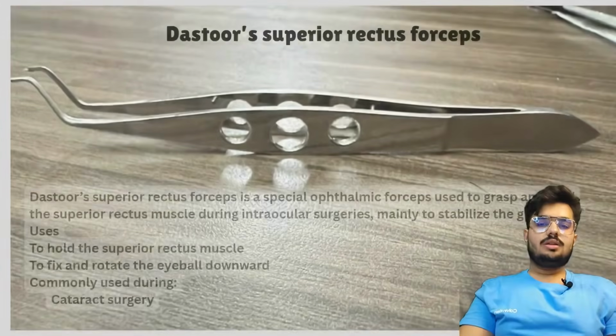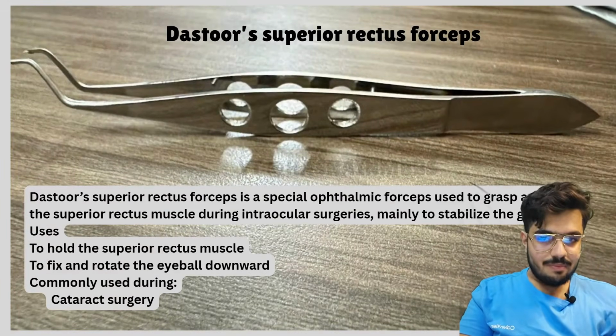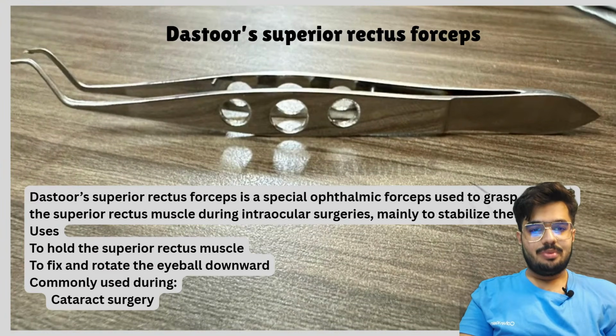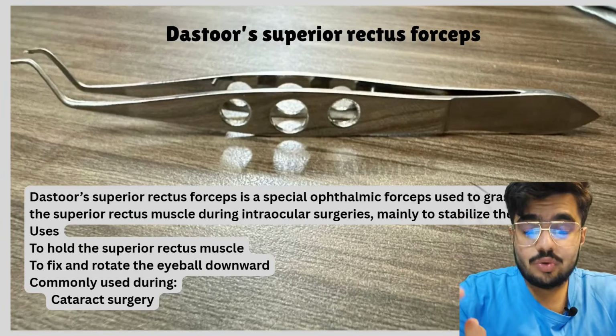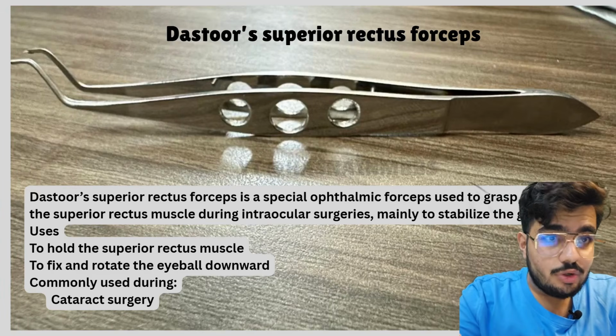Let's go further. Now we will talk about the superior rectus forceps. As the name suggests, we use this instrument to hold the superior rectus. A question may ask in which condition we need to hold the superior rectus.